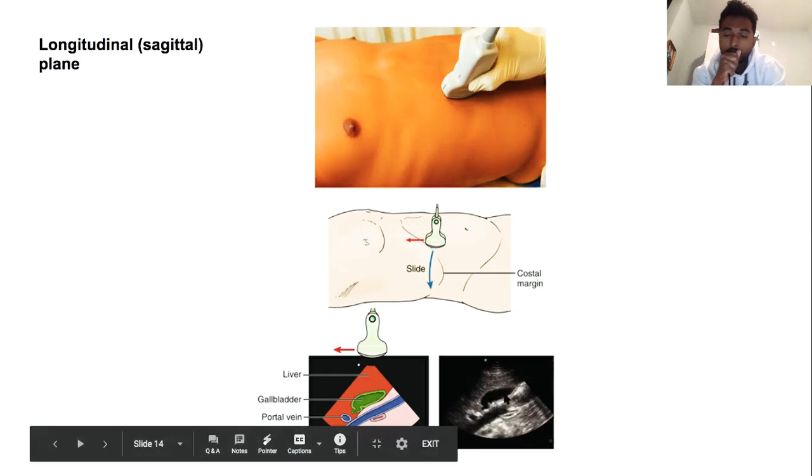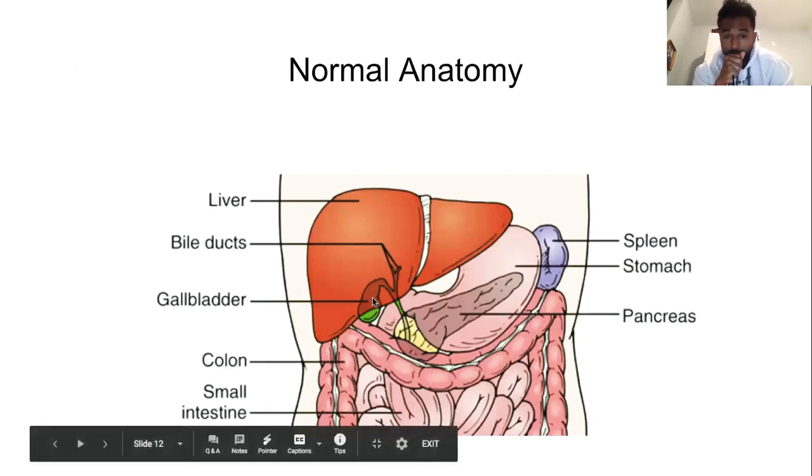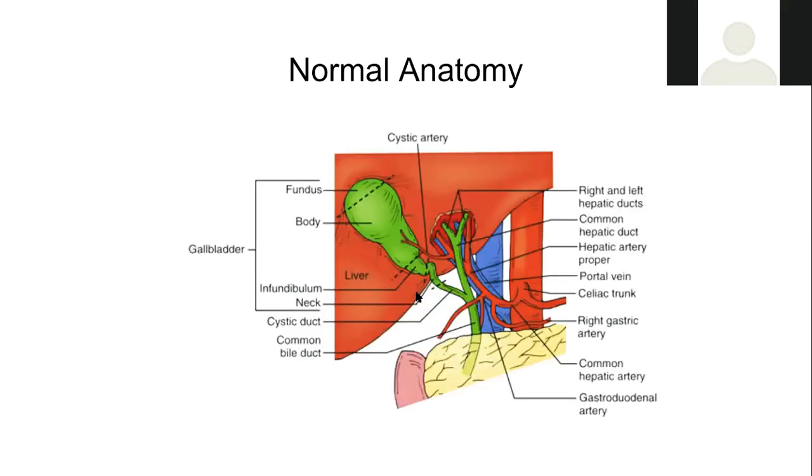I'm gonna go back real quick. So you see this right here. If they're looking at this gallbladder in profile and it's a sagittal view, and if it's tilted the right way, the gallbladder sits here and the portal vein is somewhere here. So it kind of looks like an exclamation point. Does it make sense?